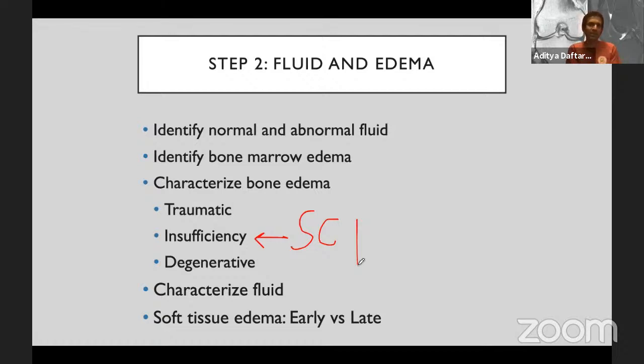And similarly, early on, we'll say, oh, this looks like a high-grade injury. This looks like, whatever else. But if you look at it a few days later, it'll look more like intermediate grade or median. And this is especially true for something like the MCL, which remodels well.